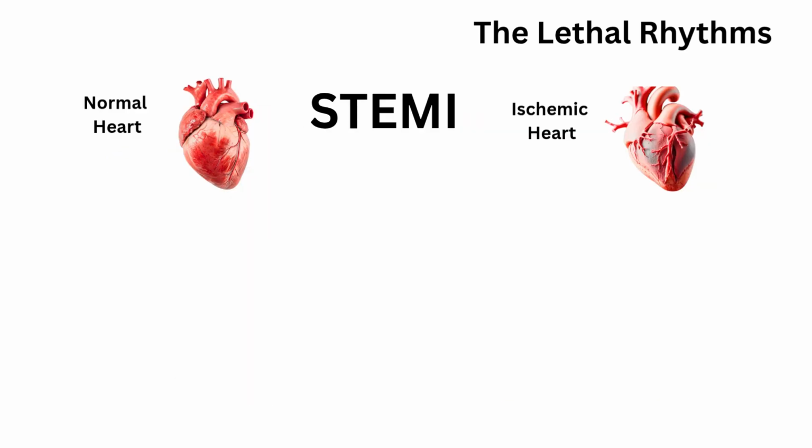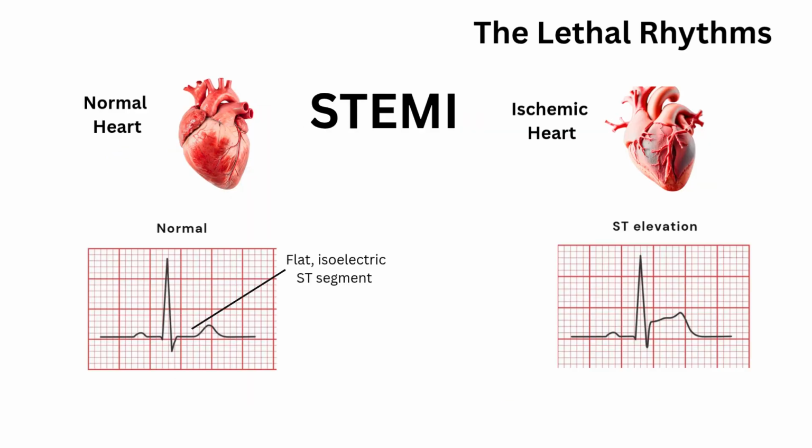Just look at the sheer visual contrast here. A normal, flat, isoelectric ST segment means the entire ventricular myocardium is depolarized, there's no net electrical movement, and the heart is safely resting. But that elevated ST segment, it's lifted significantly above the baseline. It serves as the universal fire alarm for a myocardial infarction.